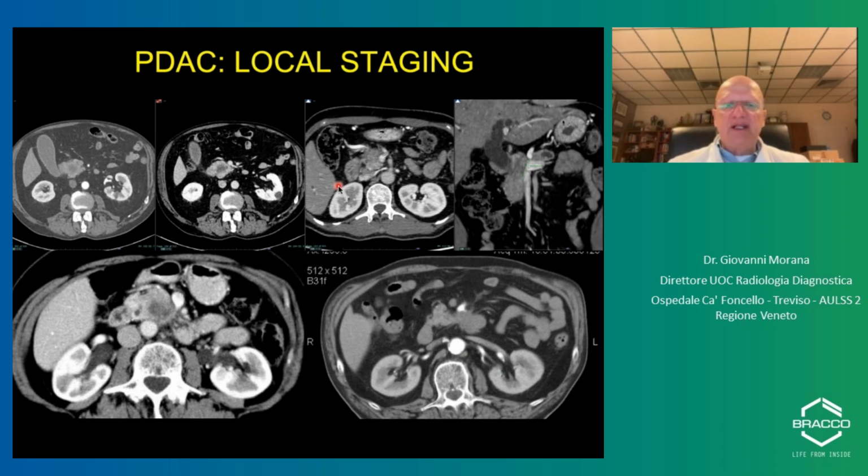So in local staging, multi-detector CT is the best imaging technique because it has a very good vessel depiction and a very high spatial resolution, which allows us to perform multiplanar reconstruction with very high quality images. So we can clearly state there's no involvement.